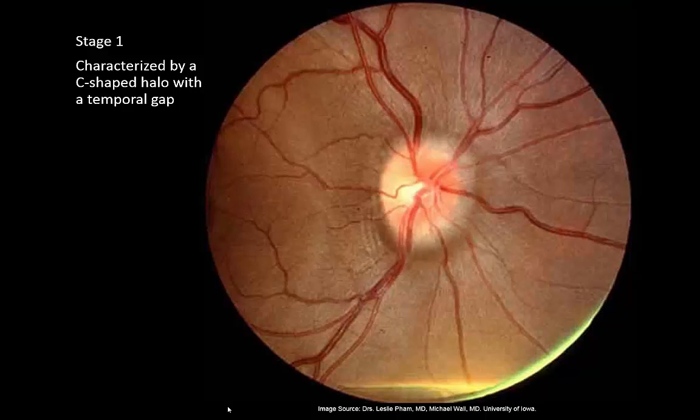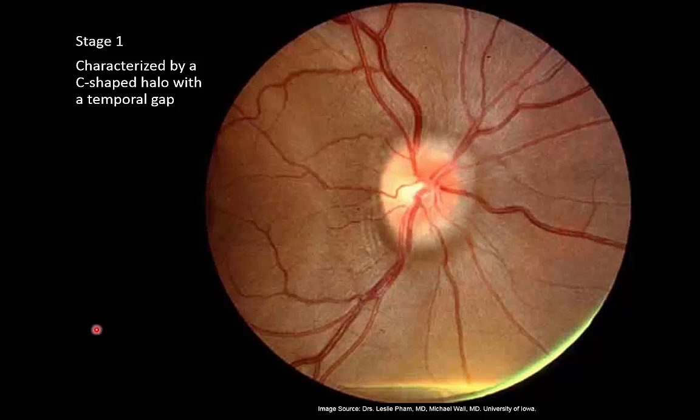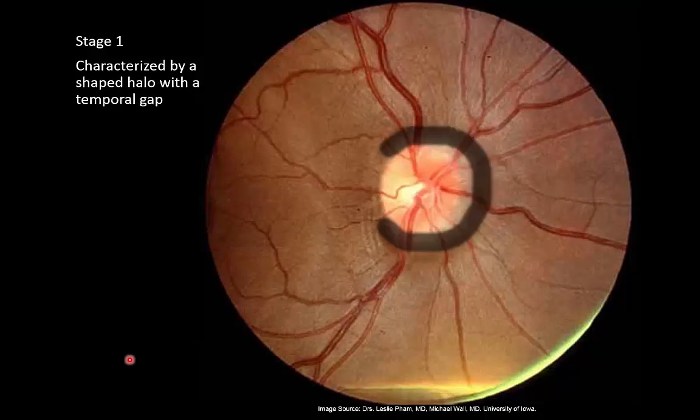So let's look at early papilledema. This is stage 1. So let's get out our laser pointer again. Here's our retina, here's obviously the disc. Now when we look at the disc, can we see the disc margin? And actually on the temporal side, we can see it fairly well. But on the superior and inferior and the nasal portion, the disc is blurred. So let's show an example.